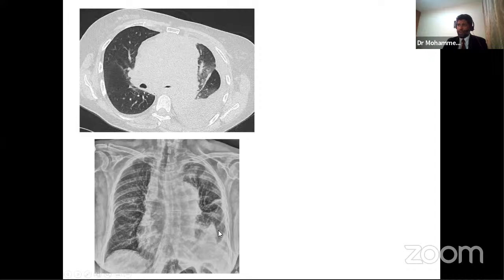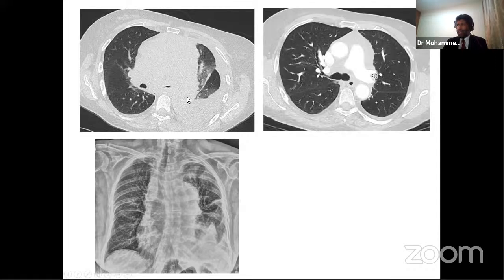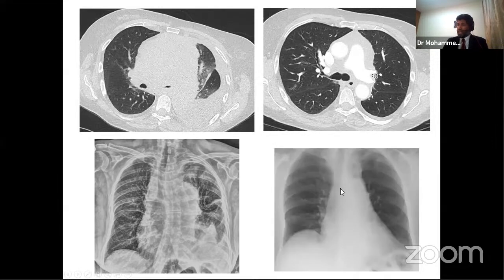The patient went on to have treatment. We drained the fluid. We can see the chest drain there on this chest X-ray. The patient went on to have the clever treatments that the hematologist would offer, and we can see that the tumor has completely melted. This patient was referred to me for a possible stent, but the patient was fortunate enough to have a very good response to the treatment. And now this is the post-treatment chest X-ray, wherein there is hardly any effusion, the drain is still there, and the mass has reduced in size.